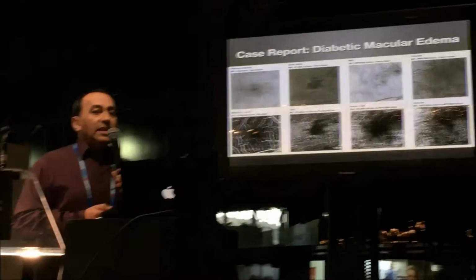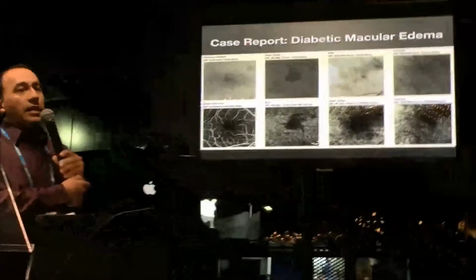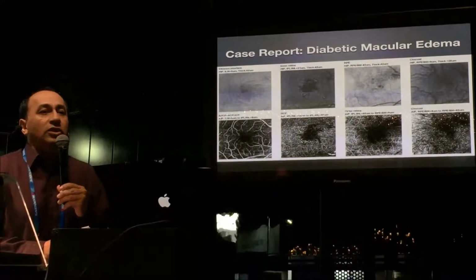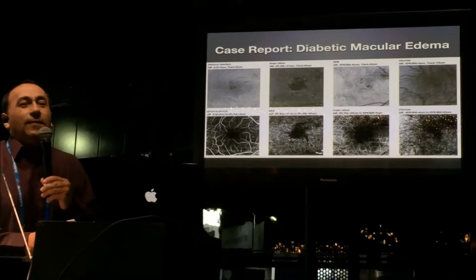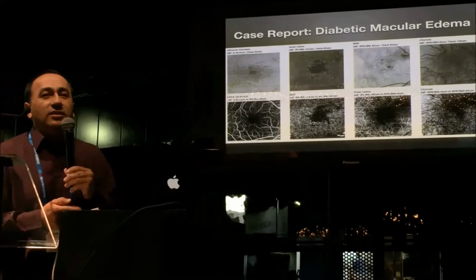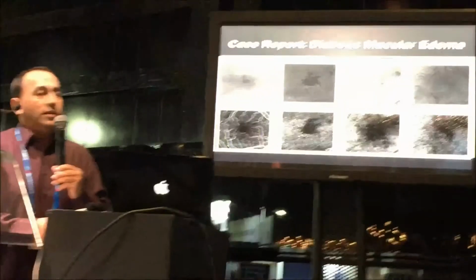With the OCT-A scan, the OCT at the level of the nerve fibre layer looks fine. The vasculature looks fine. They eventually shut down those vessels. That's a driver for producing VEGF. VEGF then leads to neovascularization and more leakage.